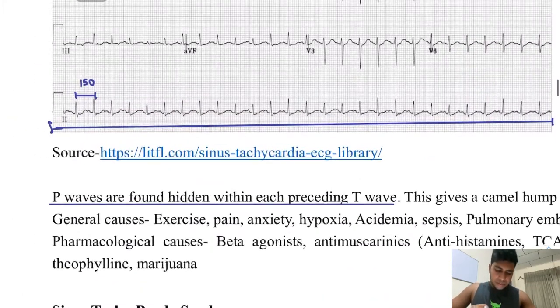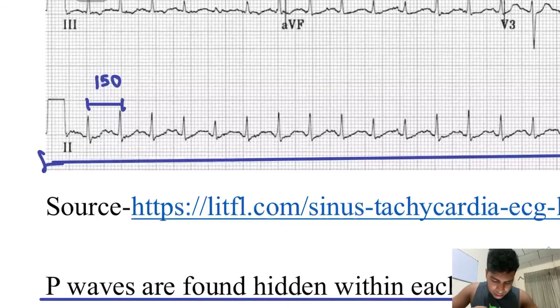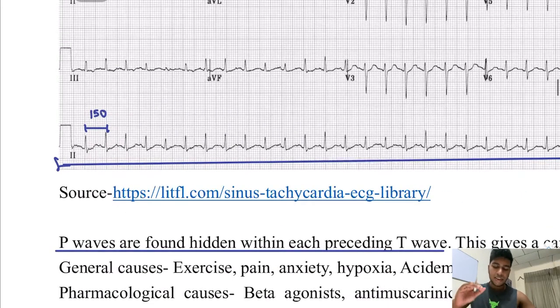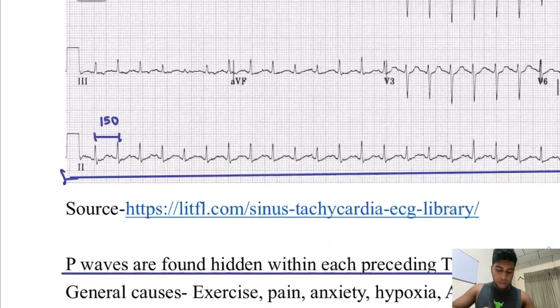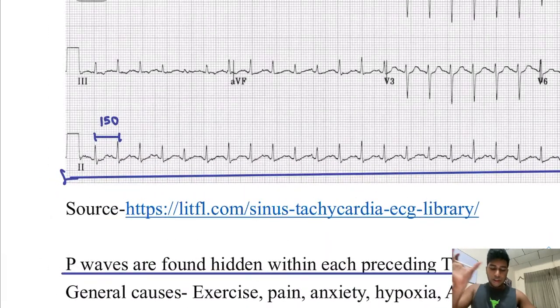And remember, don't go to count the small boxes, multiply it by things and try to find the exact rate. That's useless, because in an ECG they will tell you that rate, but you don't need to look at all those. You just need to know by the big boxes what the rate is.